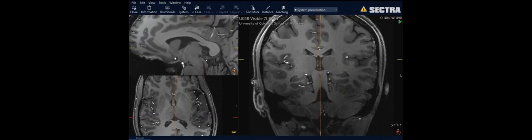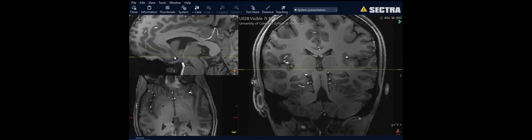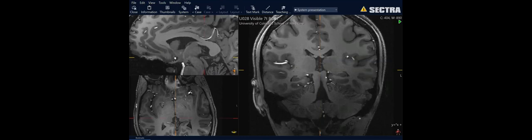That's going to be quite difficult, but we can appreciate them on the sagittal. So here is our pineal gland, immediately anterior to which it's kind of attached. If we go from the pineal to the tectum, the connecting structure is the posterior commissure. Let's work our way down. There's our pineal, and then that anterior white matter structure is the posterior commissure here. But we can't make out those suprapineal and pineal recesses on the coronal.